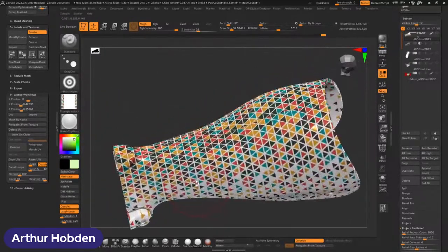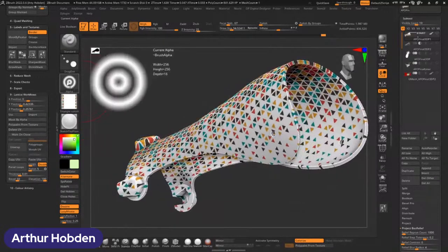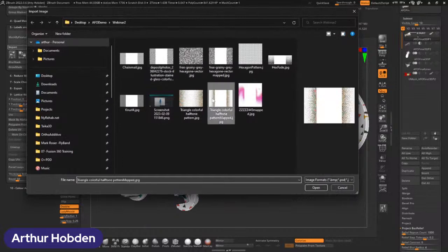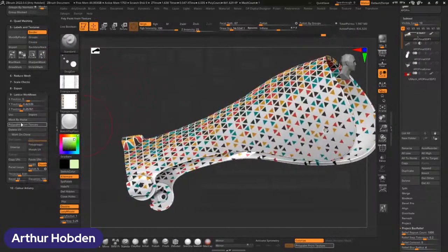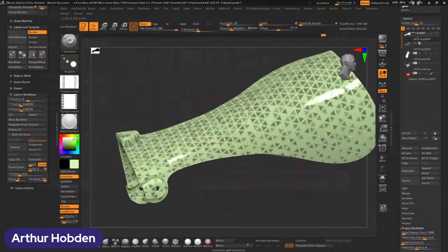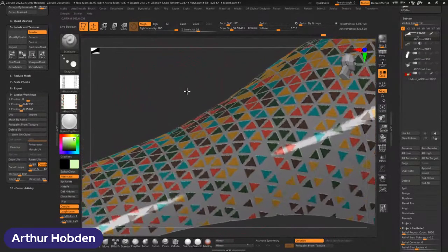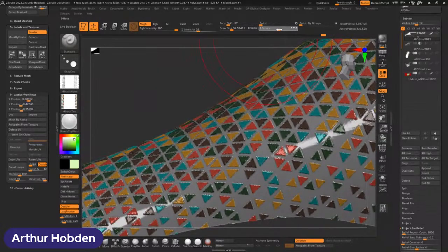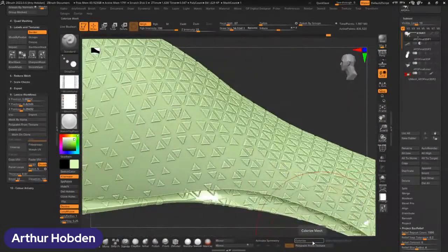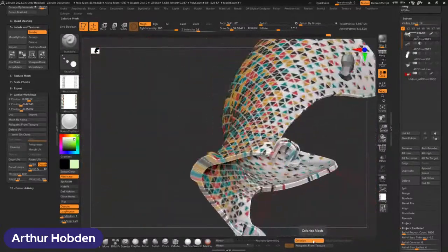So you can have a predetermined library of stuff that works for you, and you can just wrap it and apply it. And what's even more interesting is that you can load the same image into your alpha channel as well. And if you decide to mask by alpha this time, and we turn off colorize, you can see that we have a mask in the same area as our color, which means we can take that and inflate geometry based on the color itself. So the color not only is on the part, but it's also embossed with color. So that's something really interesting.